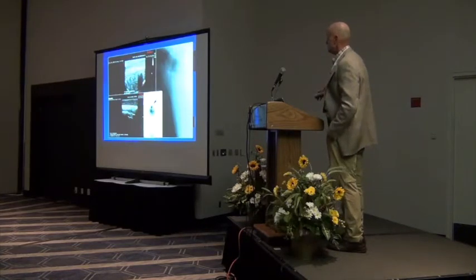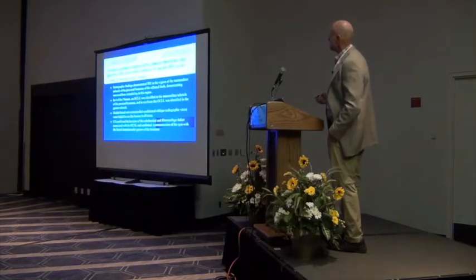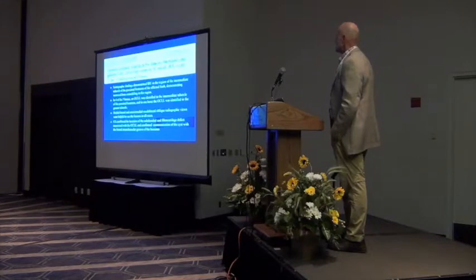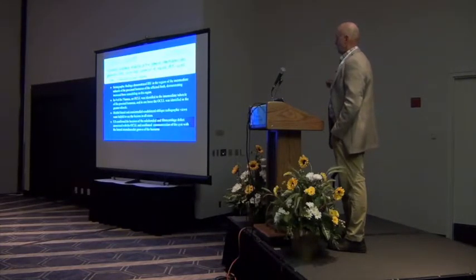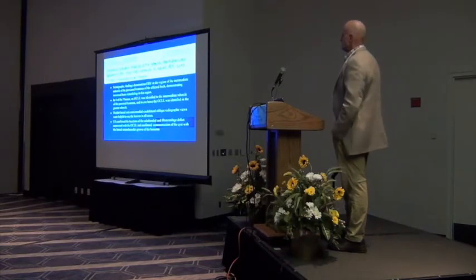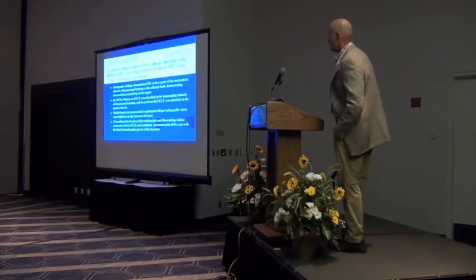I mean, you can certainly see on a bone scan that that's the area of concern. And as things usually go, we had a rash of horses that presented, over, I think, a 2-year period of time, that had osteocystic lesions that developed in the intermediate tubercle on the concave area. And most of those did very well, and I'll show you one that we had to do a little bit more of an aggressive treatment.